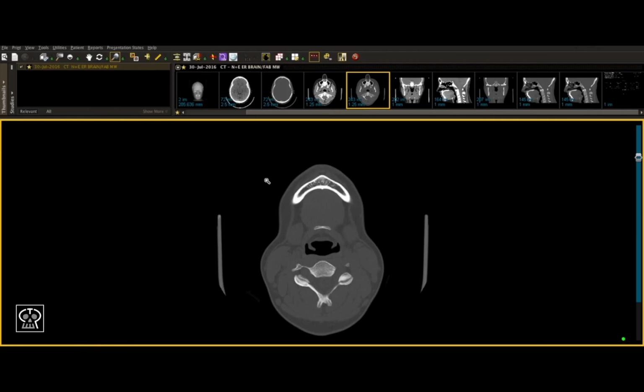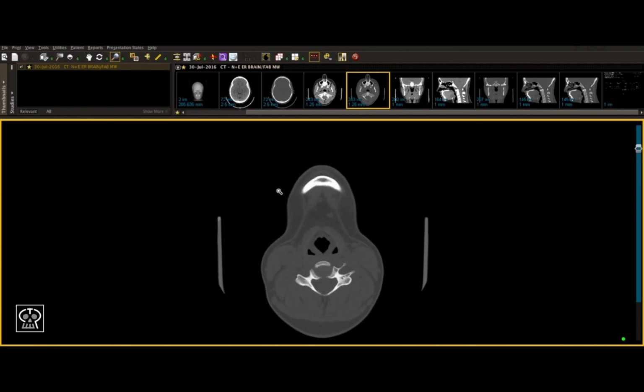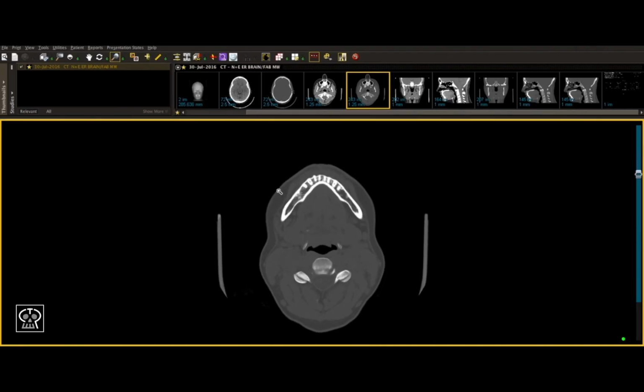The cortices in particular are extremely important, as they are the easiest to follow for breaks in them to see for possible fractures. Indeed, in a normal mandible, you should have smooth running cortices without any breaks in them. Although there are a few exceptions such as suture lines, we'll cover those at a later time. Now, starting from the inferior border of the mandible and scrolling upwards, i.e. towards the top of the patient's face, one of the first structures you'll see is the roots of the mandibular teeth.